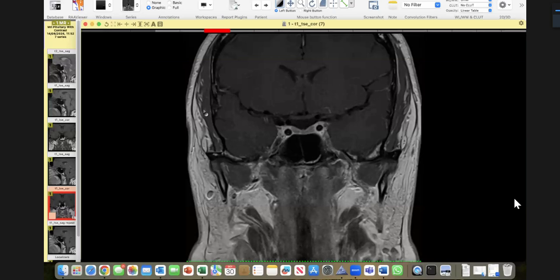So what will you tell the clinician then? Sir, I cannot see any abnormal enhancement to say hypophysitis or anything else. So what do you call this condition? Sir, it really skips out of my mind.